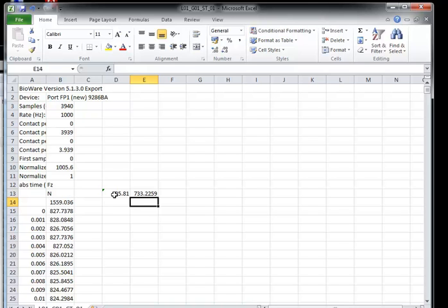You could do that a number of ways, but that way you keep it in Excel. You haven't had to note down the data. More likely to be accurate. So that'd be the method I would use.